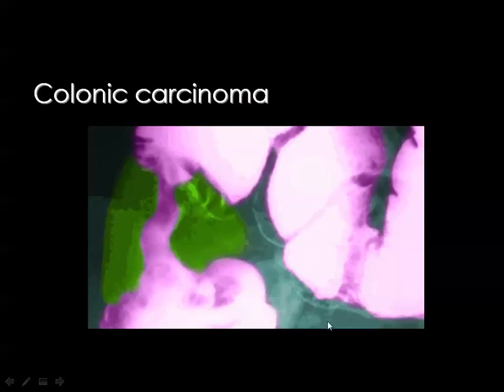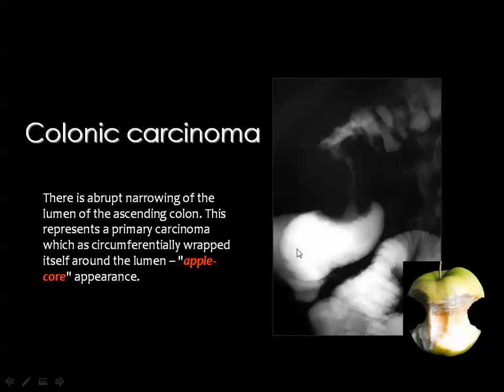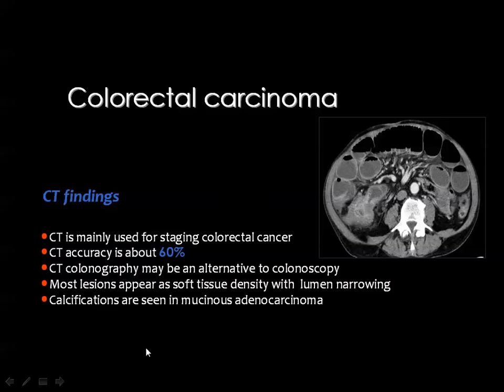Then this is the configuration of the apple core. You see this green represents the tumor tissue, and this purple will represent the residual lumen left from the carcinoma. And here is the typical apple core configuration in the sigmoid colon by air and by barium in a double contrast barium study. Classic appearance of apple core configuration in the ascending colon. This is the cecum, and this is the ascending colon, representing colonic carcinoma.